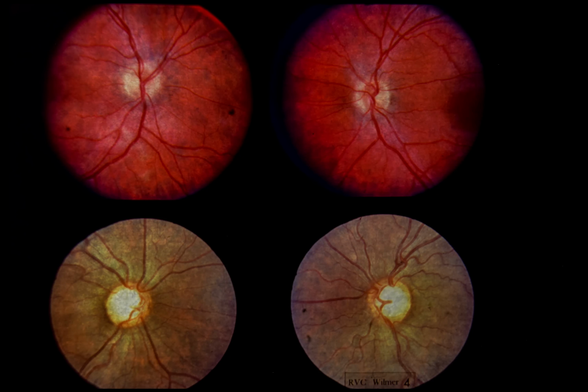Slide 4. Normal variations of the optic cup. Although most cups occupy only 30 to 40% of the disc area, large cups comprising 80 to 90% of the disc area may be observed as a normal variation in patients who have no evidence of glaucoma. Upper left and upper right. This 24-year-old male with normal visual acuity and fields has pink optic discs with well-defined margins and small central cups that occupy less than 10% of the total disc area.